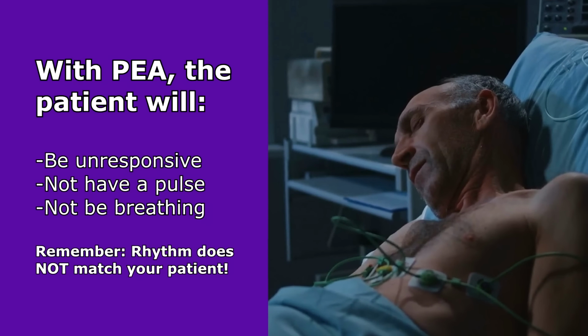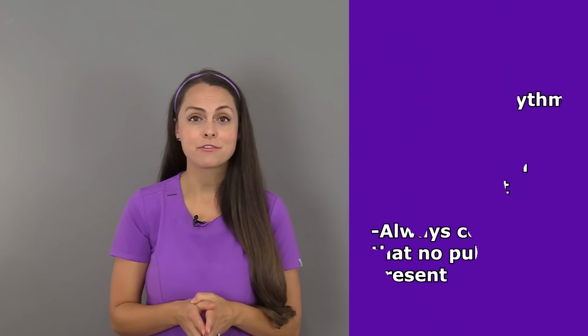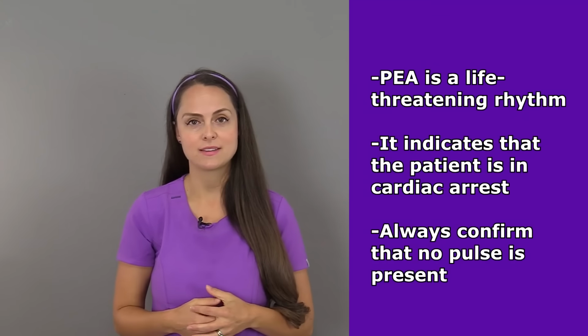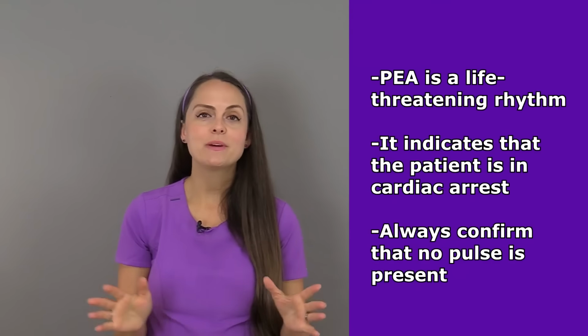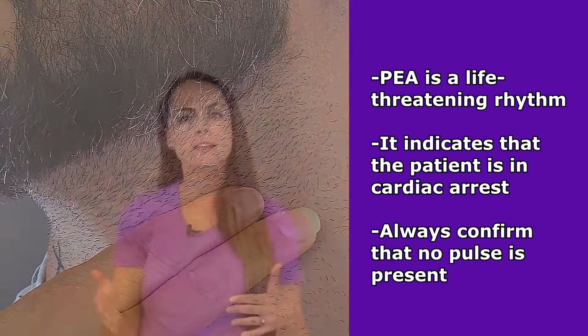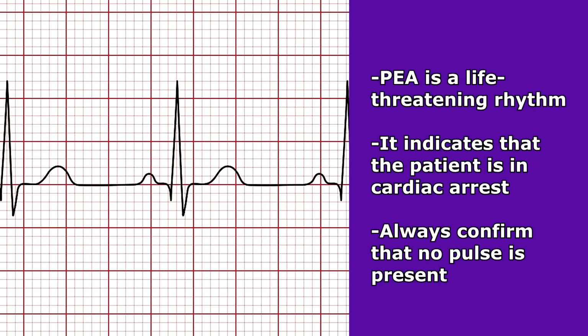They will not have a pulse and they won't be breathing. Therefore, PEA is a life-threatening rhythm and it indicates that your patient is in cardiac arrest. Therefore, as a nurse, it's always important that you check your patient, you feel that pulse to confirm your findings with what you're seeing on that ECG reading.